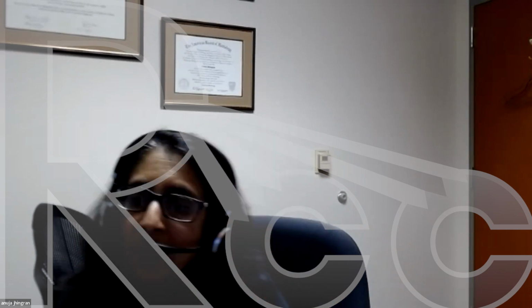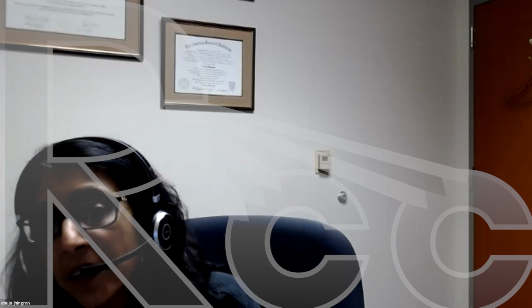For everything. What type of brachytherapy are you using in the post-op endometrial cancer? It's the same thing. Again, there's no right or wrong answer to this. I do need you to know, in the old days, we used to use ovoids, right? Now we use cylinders because they're easy. You put a dome and 2 cylinders in.